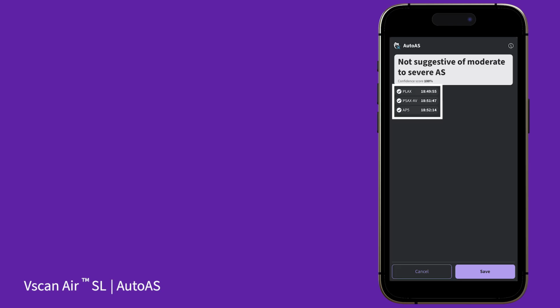The report lists which images were included in the analysis and the timestamps for each. Tap Save to store the report in your image gallery. If you tap Cancel, the report will not be saved.